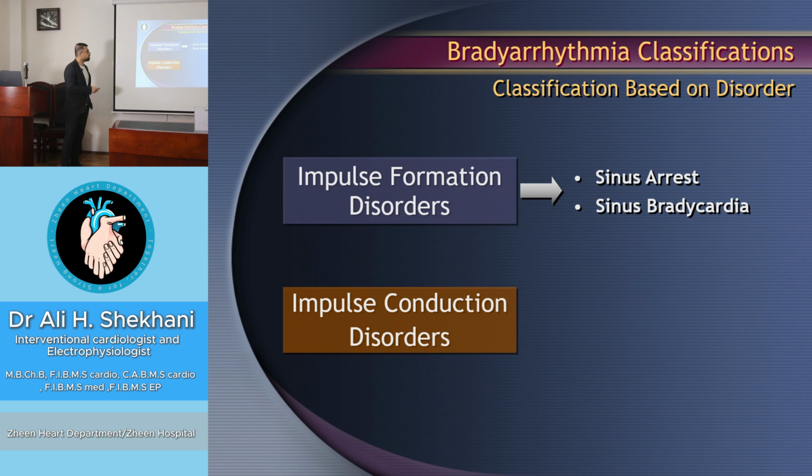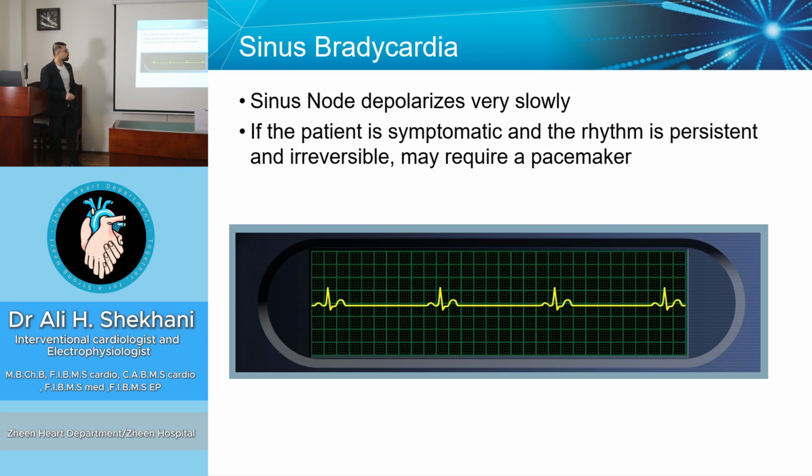The second is the sinus bradycardia. In sinus bradycardia, the sinus node depolarizes very slowly. And of course, sinus bradycardia is a benign condition. Frequently, you may see sinus bradycardia in a normal, healthy person, especially in athletes or sometimes during sleep. The indication for pacemaker is only if the patient has symptoms of syncope or dizziness. Otherwise, doesn't need anything, just follow up.